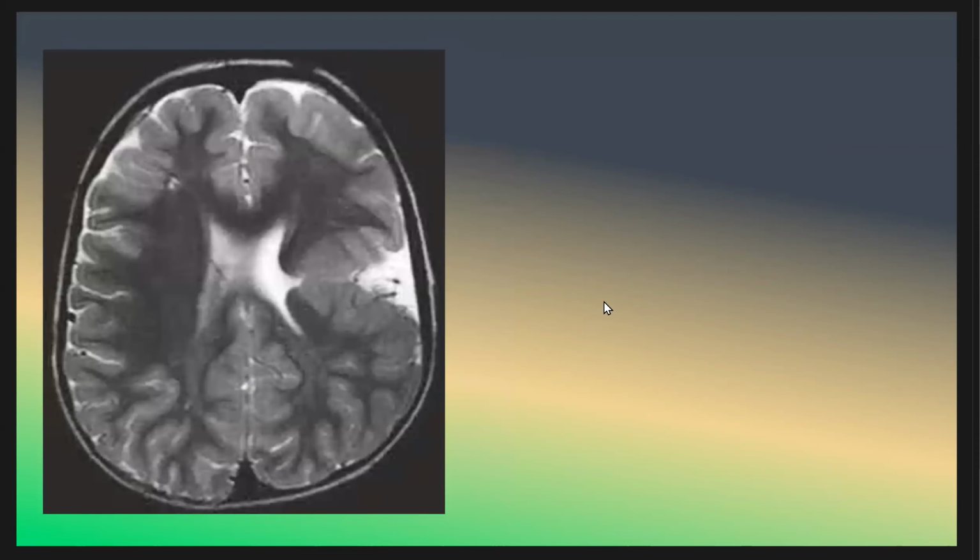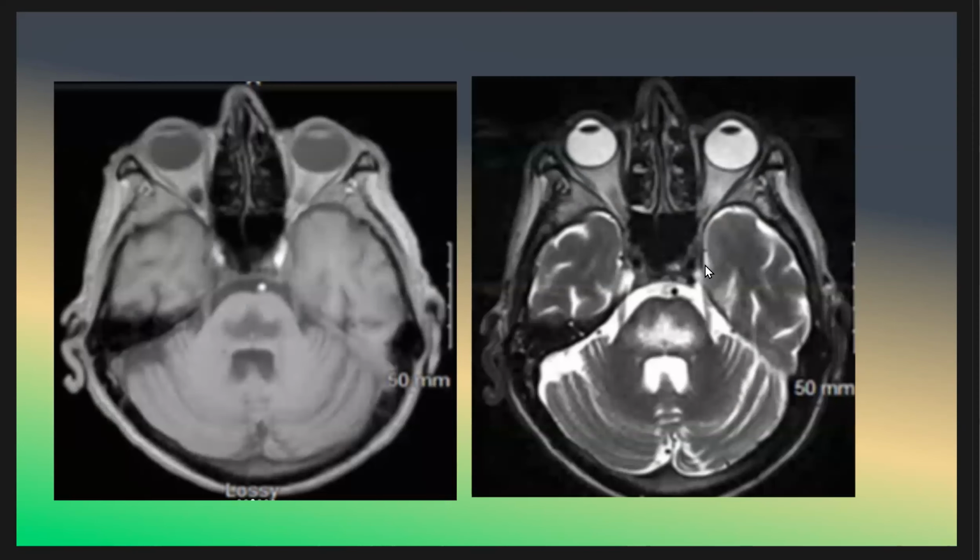Here, what do you think this child has? I think I presented this case in the pediatric imaging. Okay, this patient has a closed lip schizencephaly, and here you see it is the closed lip. It is lined by gray matter, not white matter. If it is lined by white matter, then this is not a schizencephaly. It is a porencephalic cyst. Here we move to the next case.